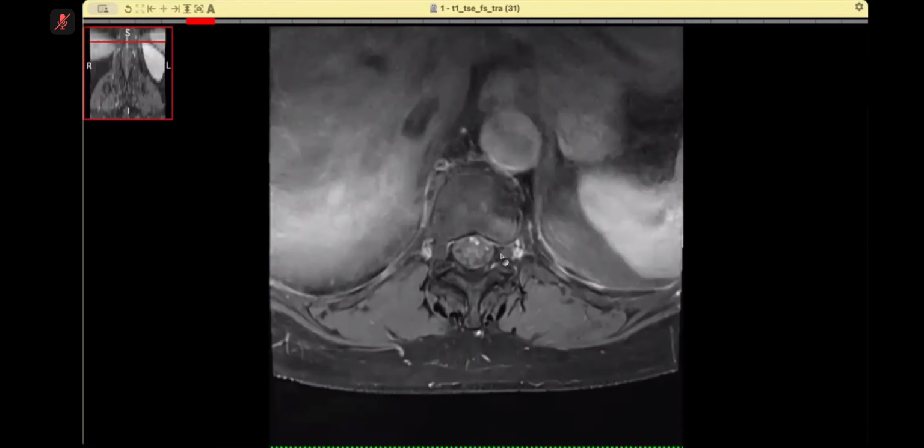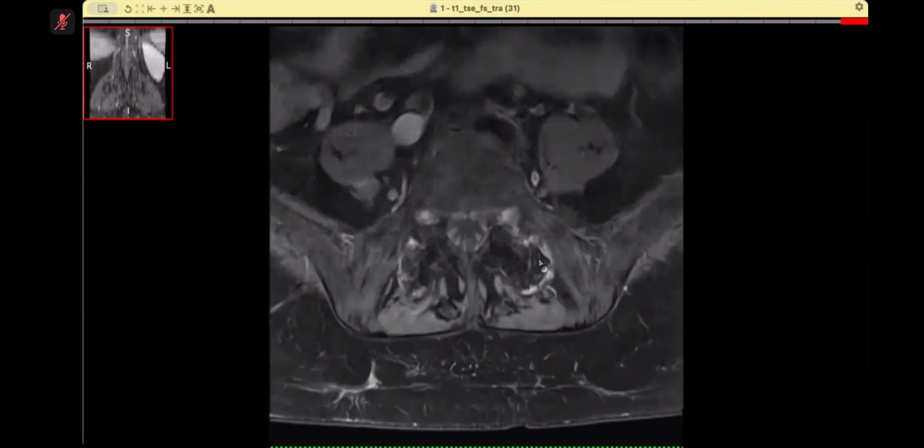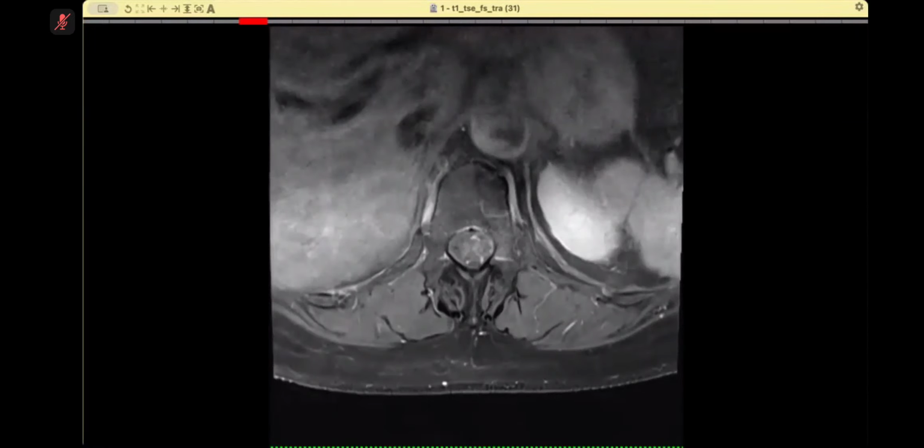Even here, you should not be seeing these prominent vessels, anteriorly and posteriorly. Even on an axial, you can see, and you can imagine that part of the fistula might be sitting here, and these are very prominent veins. Okay, well done, candidate one.